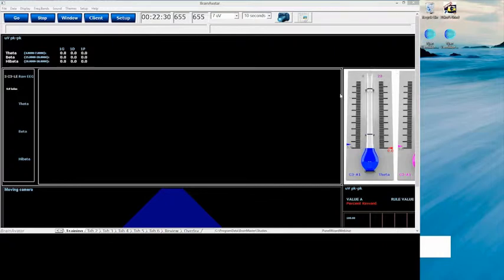Well, in the BrainAvatar software, we added a couple new features. One of those being that we had multiple tabs, so that you can have your own individual view on a different tab. And we also gave the ability to make the information that you're looking at work best for you. And that's where Panel Wizard comes in. If you guys have talked to me or called me on the phone here for technical support, you probably heard me mention that a good couple times. And I'm going to go over that now and how you get into it.